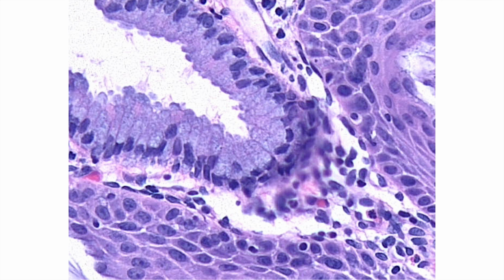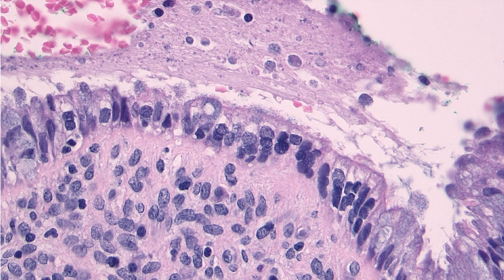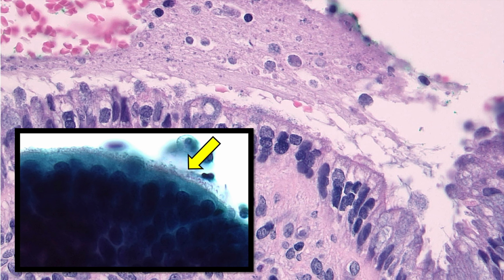This is a view of normal endocervical glands in a histologic section at the cervical transformation zone with basally oriented nuclei and apical mucinous cytoplasm. In some samples, you can see reactive changes, and in this one, you can see tubal metaplastic change. Another important change to note on histologic section, as it can also show up in pap smears, where it can have some features which would be concerning for atypical change, including overlap and crowding nuclei. But when you notice the cilia there with the yellow arrow at the top, you can explain the presence of those cells.